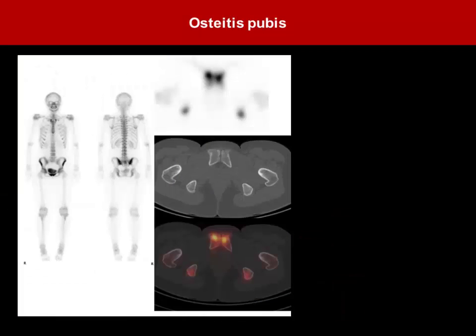So we discussed the symphysis, increased uptake. You see some irregularities, sclerosis, increased uptake bilateral. There are some changes in the cortex there. Again, look at the outline here. The posterior and the lateral parts are very pristine. As you go along the anterior part, you see irregularity. This one is still relatively better. And then you've got loss of joint space. So osteitis pubis.